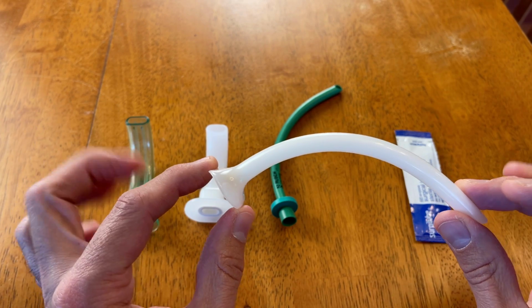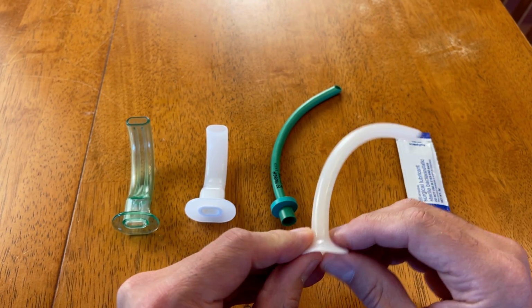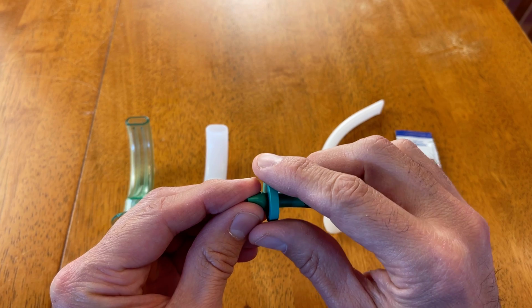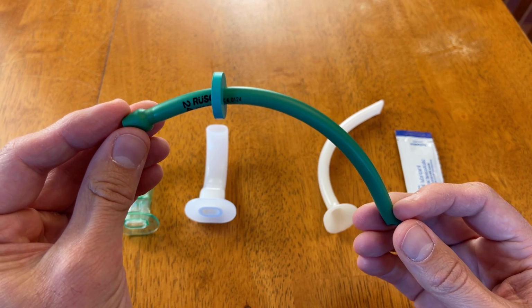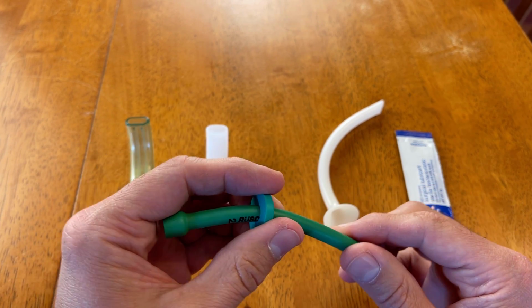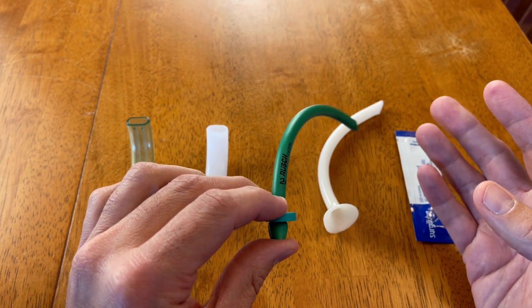Interestingly, when we talk about the NPA, there are several different varieties out on the market. This is one standard size that is a one-piece device, but there's also ones like this other one I have here where the flange is adjustable, where I can actually move this up and down the catheter to size it and fit the patient that may need this device. So it's kind of interesting just to be familiar. There are a few different varieties out on the market, and these are just a couple examples of those.